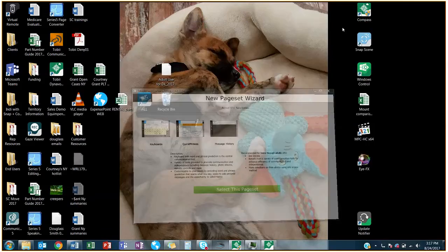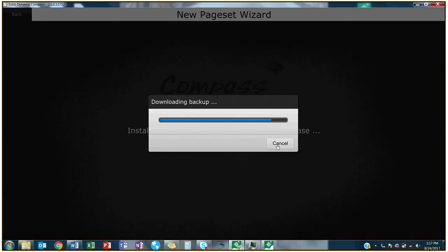So I'm going to switch over to that other window that already has it open, or is finishing opening up right now. I'll also show you how we can switch to the Navigator user if you might have accidentally picked the wrong user, but you would like to use the Navigator user.